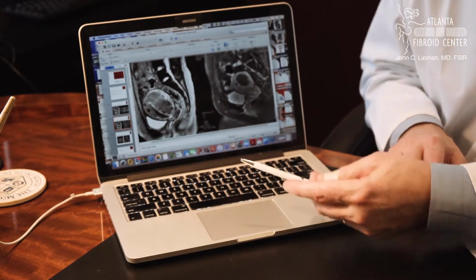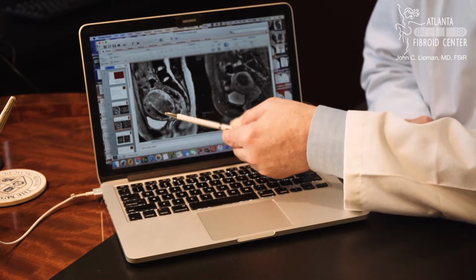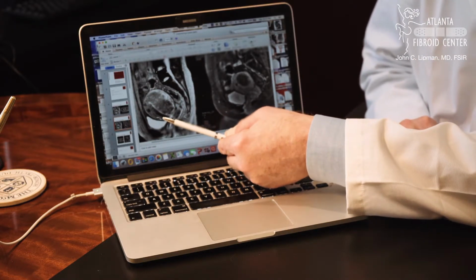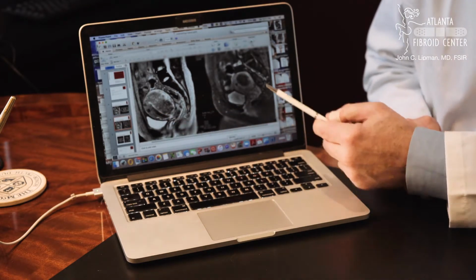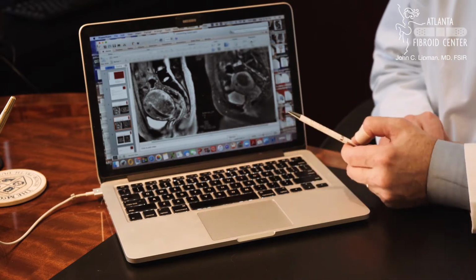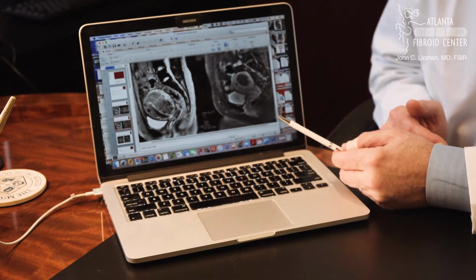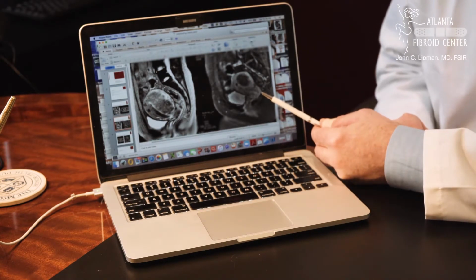So here's that same patient, again, from the side view image, showing the enlarged uterus, showing the thick area of adenomyosis, particularly behind the white cavity, but also in front, as well as a couple of tiny incidental fibroids. We performed the uterine artery embolization procedure, and then 3 months later she came back to see us, and all of her symptoms were gone. No more heavy periods, no more pelvic pain, and we obtained the MRI. This time we obtained the MRI with contrast.